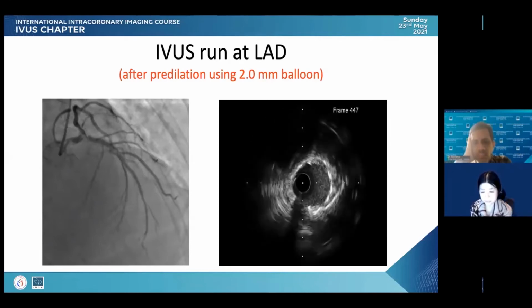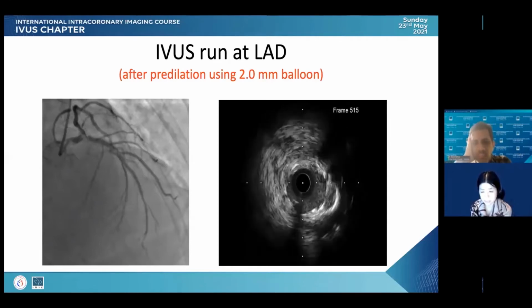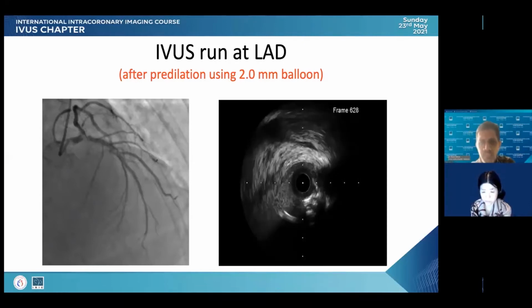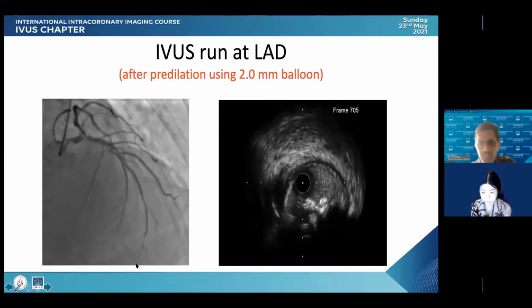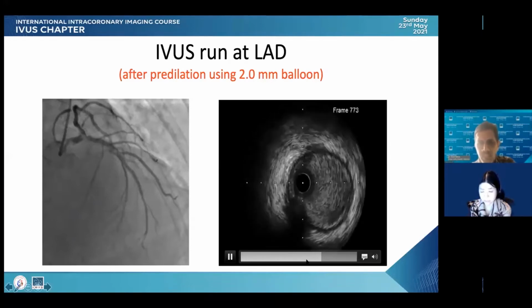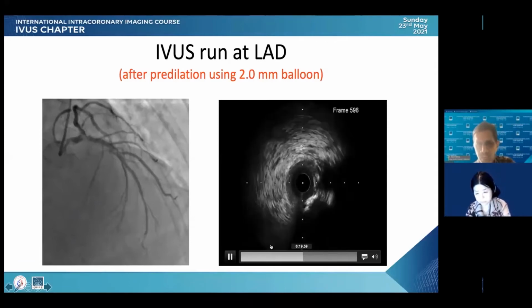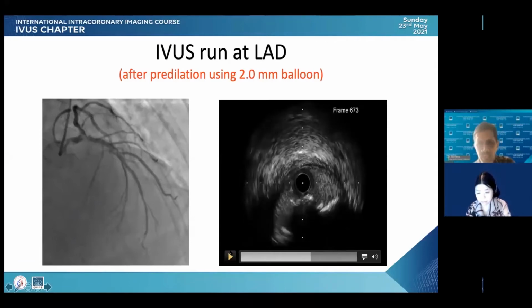And not too much neointima inside, but the vessel is much, much larger. The stent stops here, and then that's already the circumflex from the 6 o'clock, and the left main, that's a very typical picture of the calcified nodule. We have to remember, when we see an MI patient, we think everybody has thrombus.